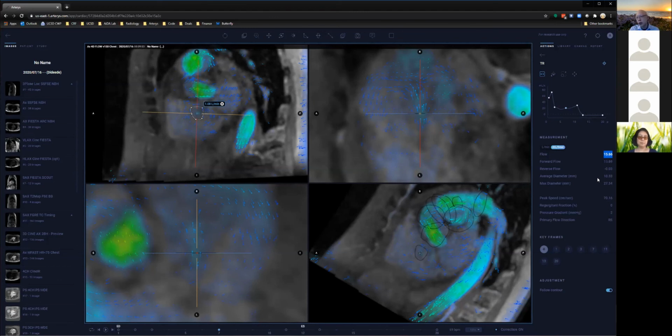This is well below that. So when I report mitral and tricuspid regurgitation, I will report both. I'll report regurgitant fraction as a percentage of the forward flow, in this case 11%, as well as regurgitant volume of 15 mils, which is well below 25. So I know it's mild. So that's nice as a way of checking yourself that all your interpretations are consistent.